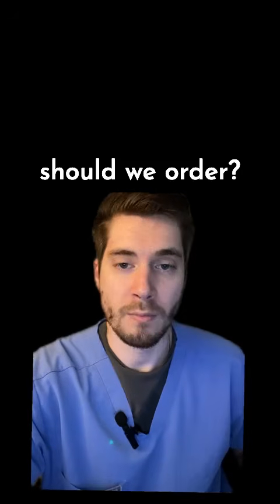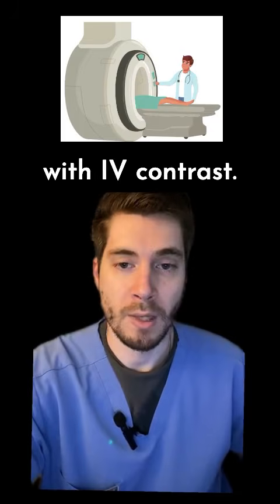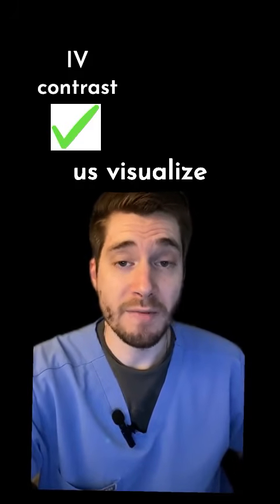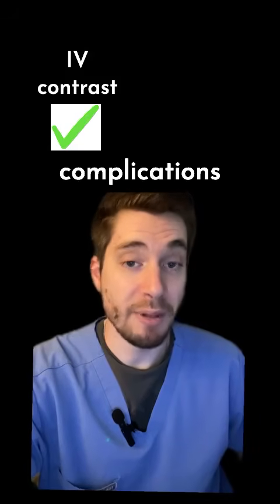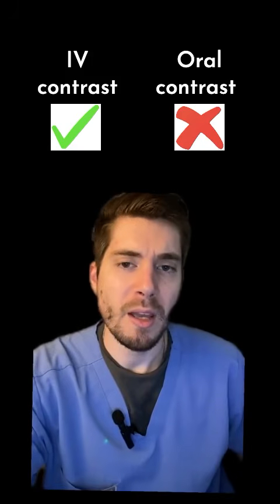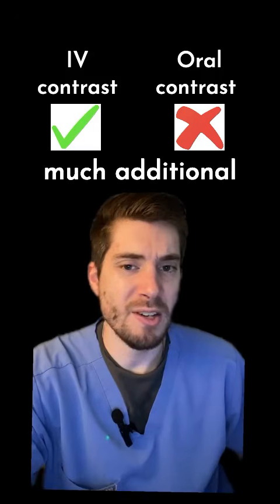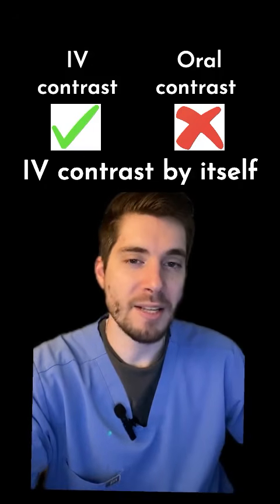First, what should we order? Guidelines recommend ordering a CT abdomen and pelvis with IV contrast. The IV contrast will better let us visualize the appendix and evaluate for common complications of appendicitis. But do we need oral contrast? No. Administering oral contrast will needlessly prolong imaging acquisition and not provide much additional information. IV contrast by itself will do the job.